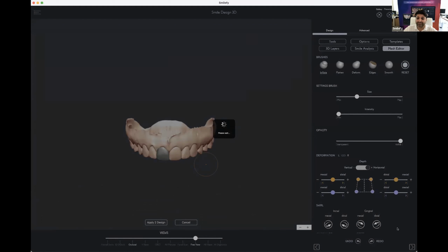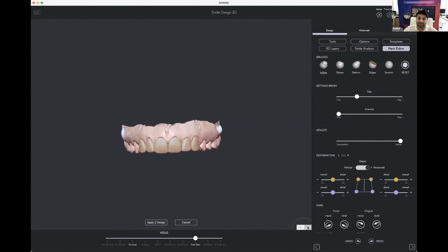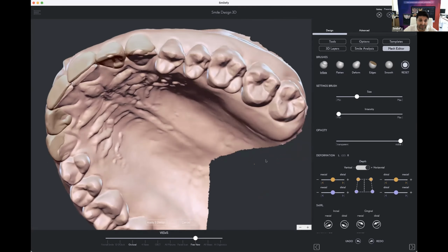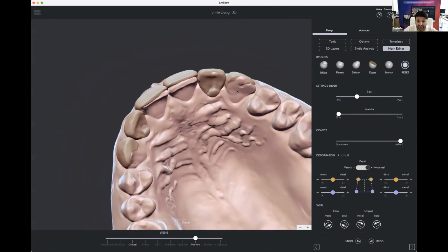The way you design doesn't matter, but now we calculate the difference between the design and the patient's teeth form. So the teeth are going to match exactly the patient's form, and you can create shells, for example. I'm going to take the flatten.